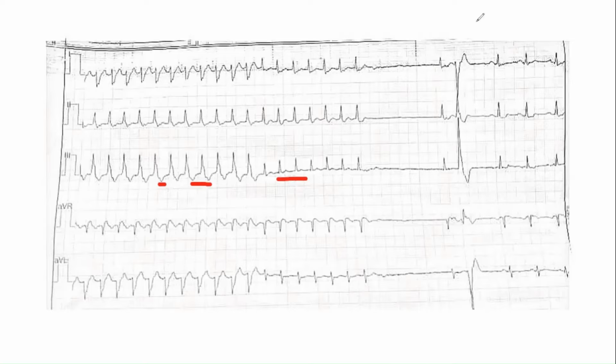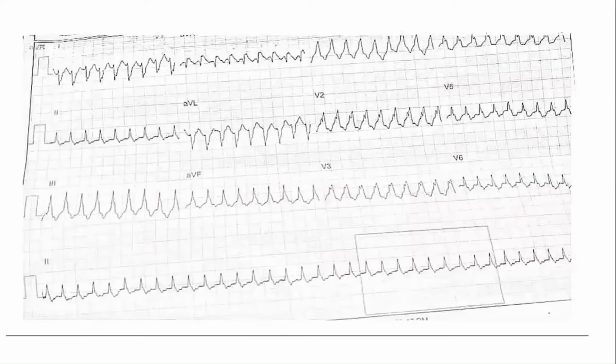So just see the ECG again, because they will not give you this ECG for sure. They will give you the previous one. I'll show you that ECG once again. So just see this ECG and always think of a typical right bundle and look for the P wave. So 1 to 1, with a typical right bundle, will most likely be SVT with aberrancy.